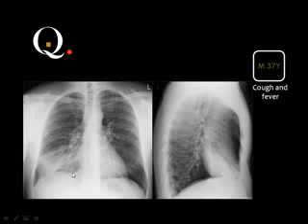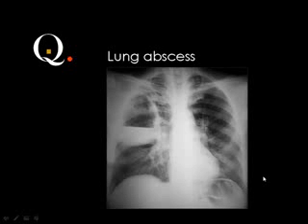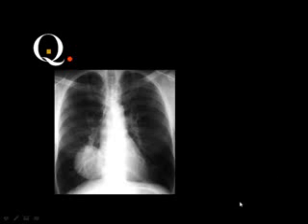Nodule, mass, patch, cavity? Patch. Patch without history or with this history? Yes, this is a pneumonia. Very good. Nodule, mass, patch, cavity? Cavity. With air fluid level, and the fluid level is straight. Then you are dealing with lung abscess. Very good. Okay. Nodule, mass, patch, cavity?